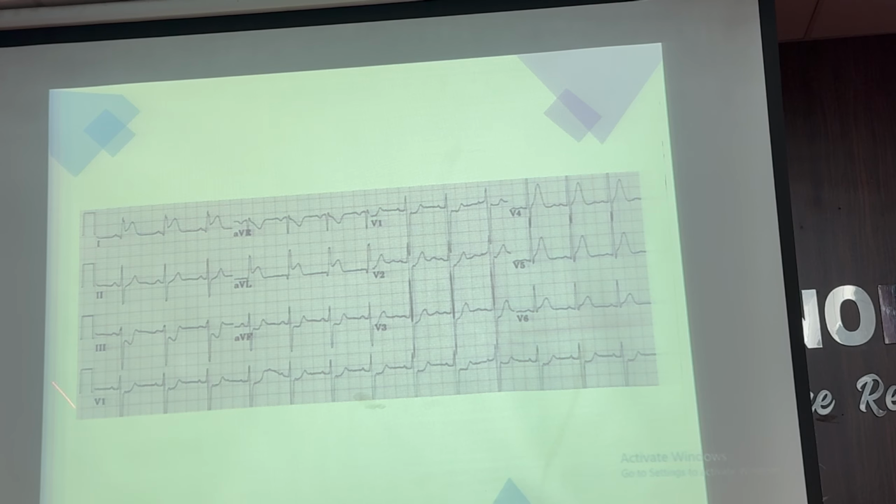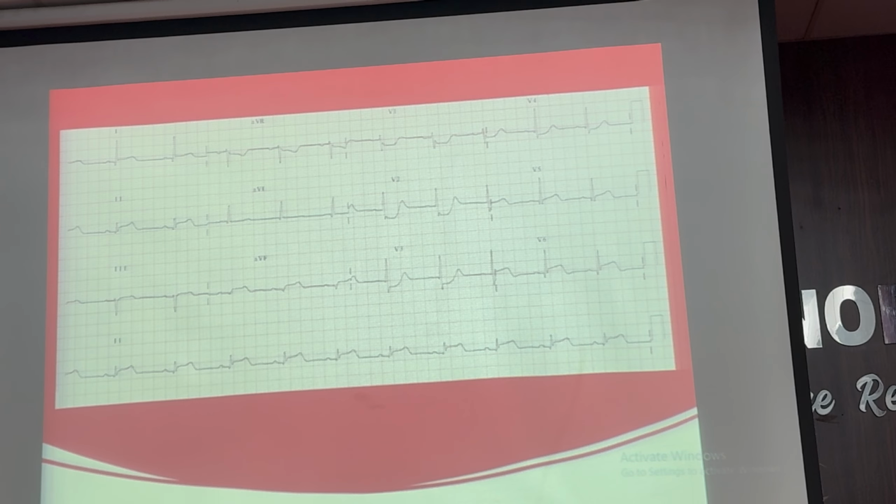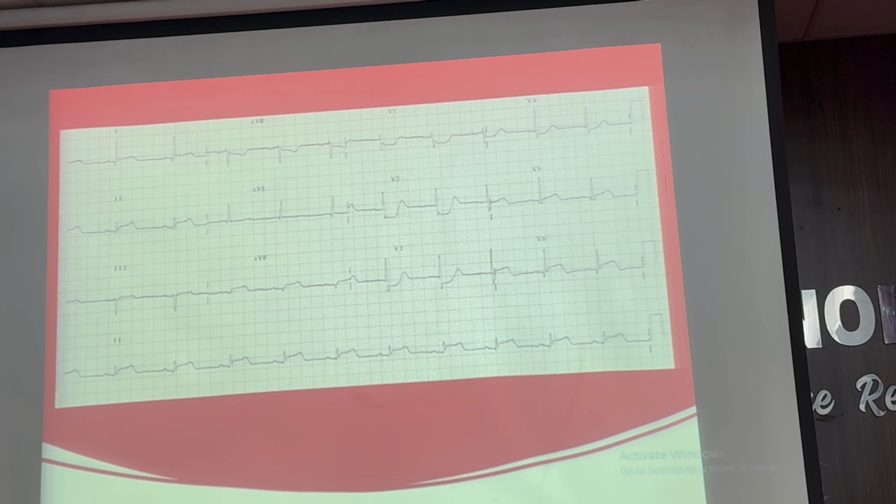Right. This is another territory again, just pure high lateral STEMI and reciprocal changes in the inferior leads. And right, so again, this is an inferolateral STEMI with the posterior extension. So lateral STEMIs can be associated with inferior and vice versa. So again, this is an inferolateral STEMI with posterior extension.